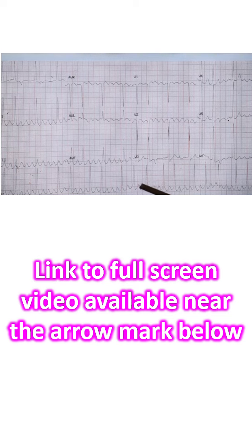Here you have 3:1 conduction. There are two flutter waves in between and there will be one on this QRS also. So there is a variation in flutter conduction in this case. Then it is easy to recognize the flutter waves because you will see the flutter waves between the RR intervals.